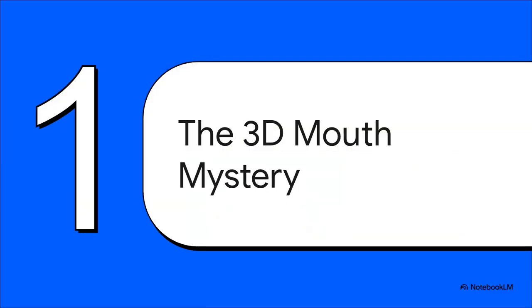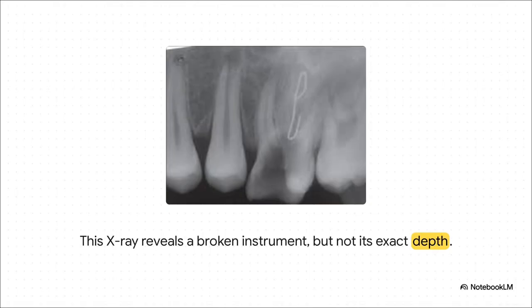Let's get into it. You know, every single day, dentists are faced with these little puzzles hidden right inside our mouths. So let's open up our first case file and see exactly what kind of challenge they're up against. So here's our first piece of evidence. It's an x-ray, and you can clearly see something that shouldn't be there, a little piece of a broken instrument.